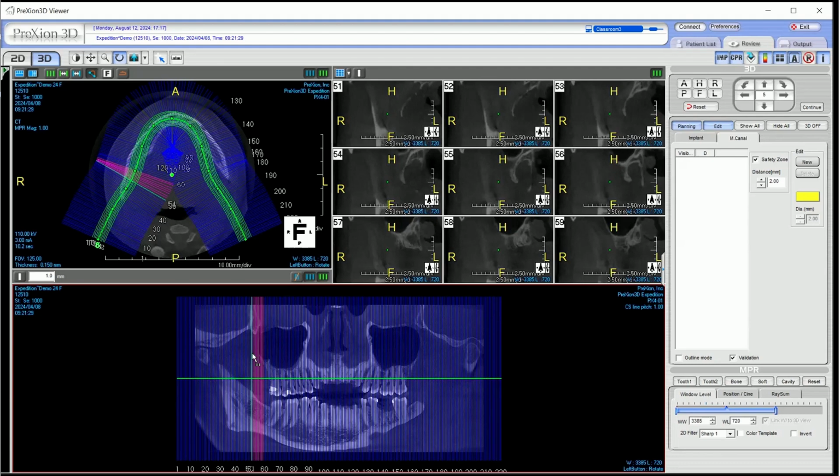In the CPR window, you'll see a set of lines in different colors that might be a little bit confusing. So in this video, I'll do my best to explain what we're looking at. First things first, make sure that in your CPR center toolbar, the thickness of your panoramic view is defaulting to 1 millimeter thickness.